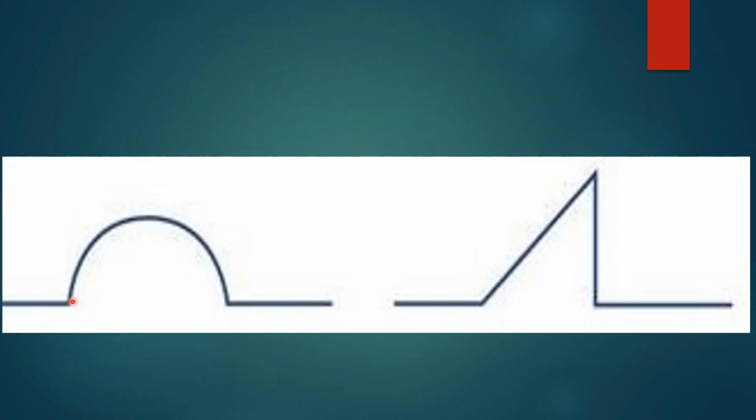Some ventilators offer different ways to deliver the flow to the patient. This waveform here is called the sine wave, and this is seldom used that I've seen, but I believe some people probably use this. It should be the most physiologic way to deliver a breath, because when we breathe spontaneously, our peak inspiratory flow is in the middle of the breath, and that's the purpose for this kind of design. But since you have slow flow at the beginning of the breath and slow flow at the end of the breath, it makes inspiratory time much longer. And this waveform is available on some ventilators.